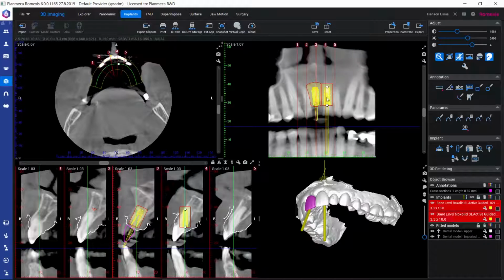So this patient doesn't need more implants, but with the 2 implants, I just wanted to show you one more positioning tool that we can use. So if we are making a case with several implants and there would be the need to align those implants in a parallel way in all 3 dimensions, we could select as master implant that implant that we would like to use as reference for the alignment.